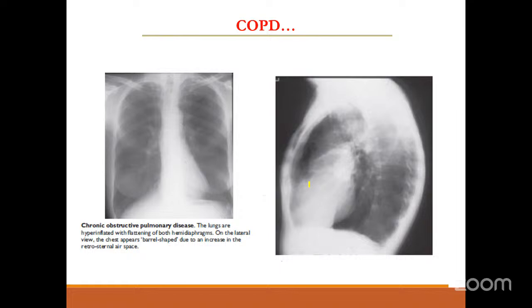So this indicates COPD. From a clinical pharmacist's point of view, by looking at this X-ray, you need to consider the modality of therapy you are choosing, how we are giving bronchodilators. Is there a scope that the patient can breathe so that adequate drug reaches the patient at all? You should be cautious about giving sedatives because they are very prone to carbon dioxide retention.